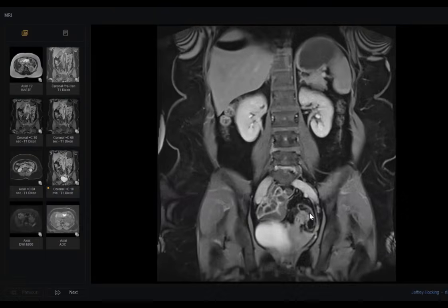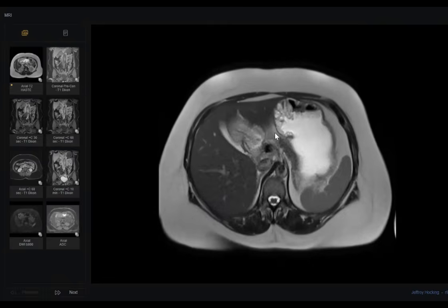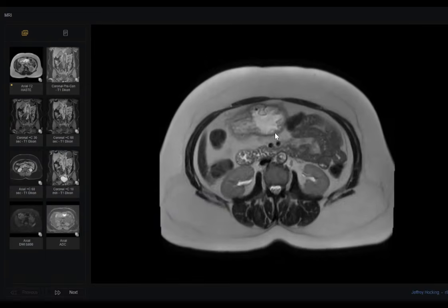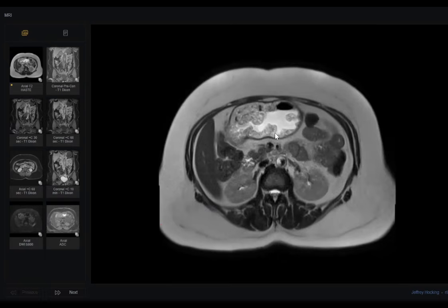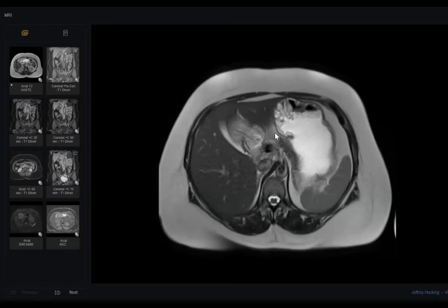Do you think if this is linitis plastica, the lumen will be like this? It would be markedly narrow. Do you think linitis plastica extends in the duodenum without any extraluminal extension? No. It may be a possibility, but what is the other possibility? Maybe lymphoma.